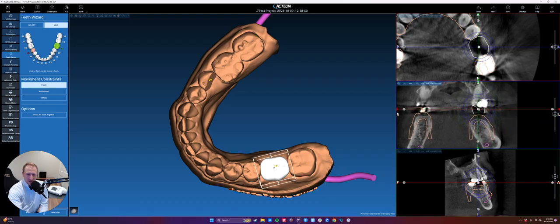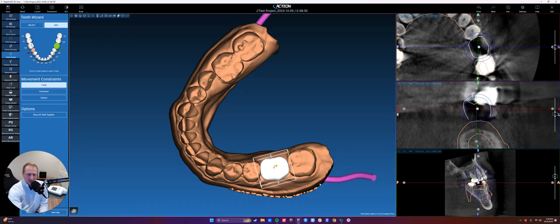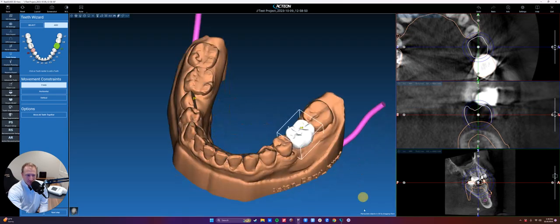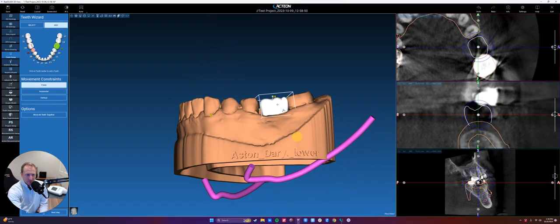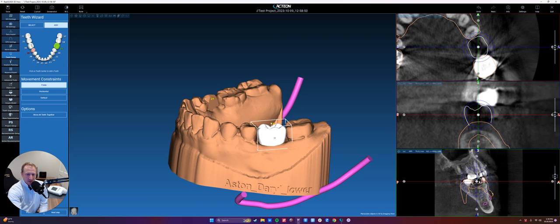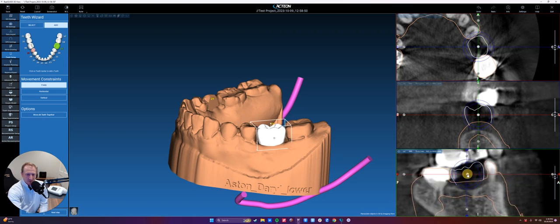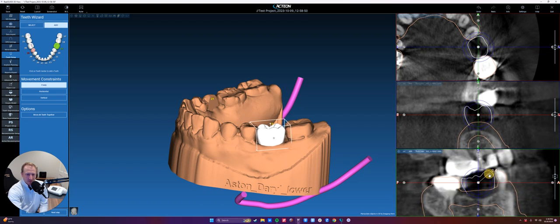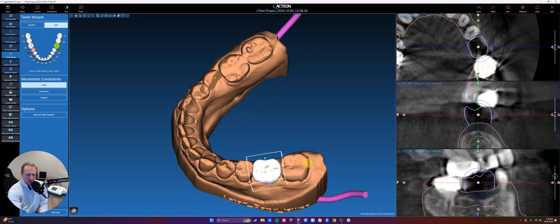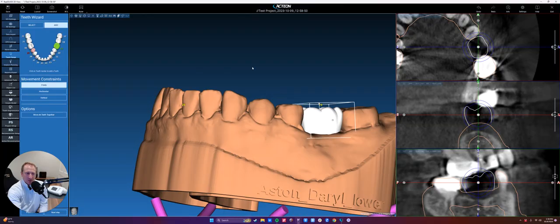Okay, now let's look at the coronal slice, and notice, as we can see here, we're hovering off the gums. So I'm going to grab the middle of that tooth and bring it down into the gum line. Okay, and that's looking pretty good. We don't have to be perfect. This is just to help us treatment plan our implant positioning, right? And then we can take a look if we zoom in here and notice, hey, we actually are tilted a little bit up. So let's bring that tilt down more with the occlusal plane. And it looks like we're kind of away. We're not touching the distal tooth, so we'll back that up a little bit as well. Okay. And that's probably good enough for what we want to do.